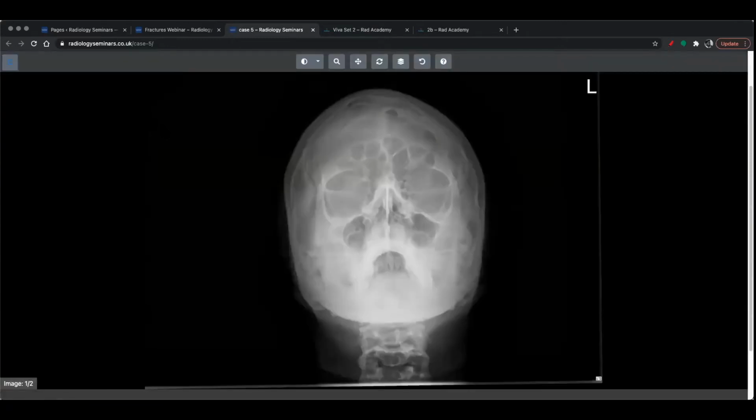Now, facial x-rays can be really, really daunting. And I find that in the beginning anyway, people are really put off by all this cauliflower looking stuff that's sitting all over here, all these streaks and all this stuff, okay? Do not worry about that stuff. Those are the normal sinuses. Those are sinuses that are part of the normal anatomy of the face and the skull and the head and all that.